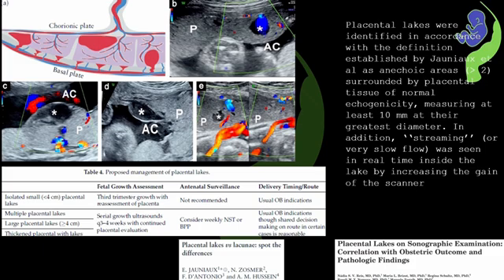In uncomplicated pregnancy, placental lakes do not cause any structural damage to the villus tissue around them and are not considered to be pathological. However, if placental lakes are associated with secondary lesions like intervillous thrombosis or fibrin deposits, then we have to think of maternal vasculopathy or placental malperfusion that is leading to these placental lakes. Small and isolated lakes are benign and only need third trimester reassessment. However, if there are multiple lakes and large placental lakes more than 4 cm, and when associated with thickened placenta, this may require serial growth assessment and then weekly surveillance in specific cases when required.